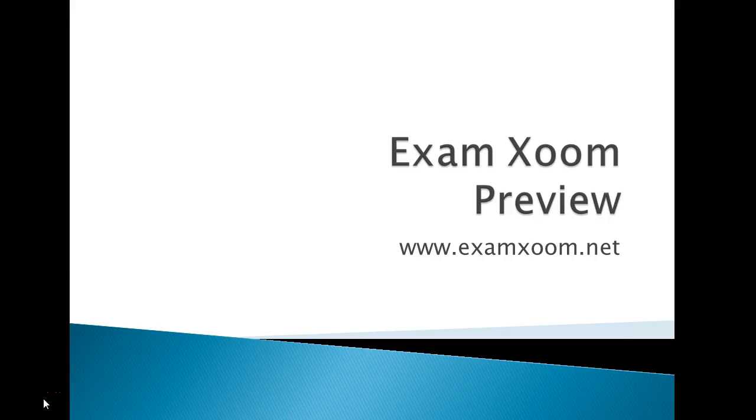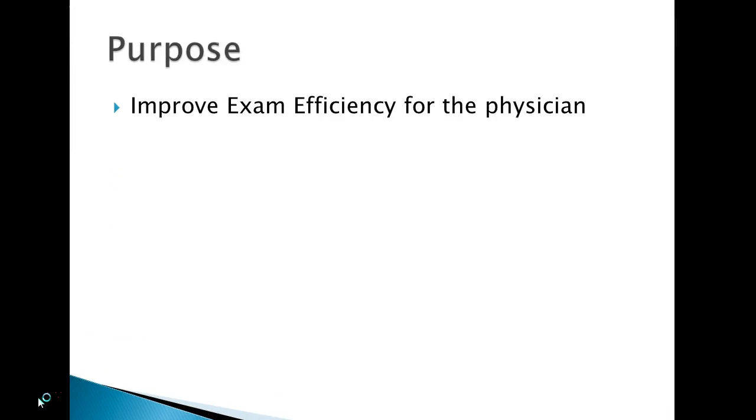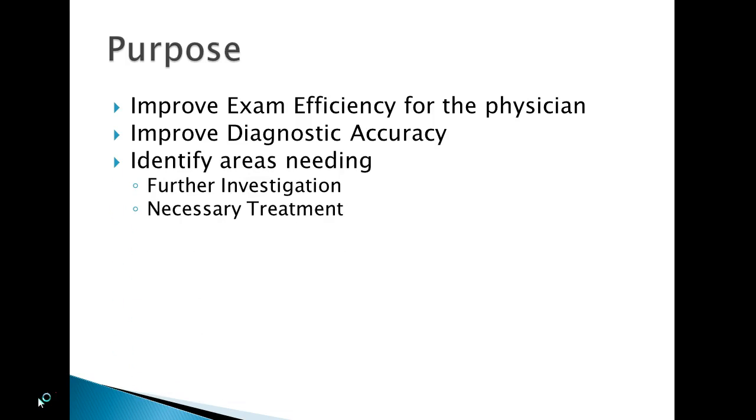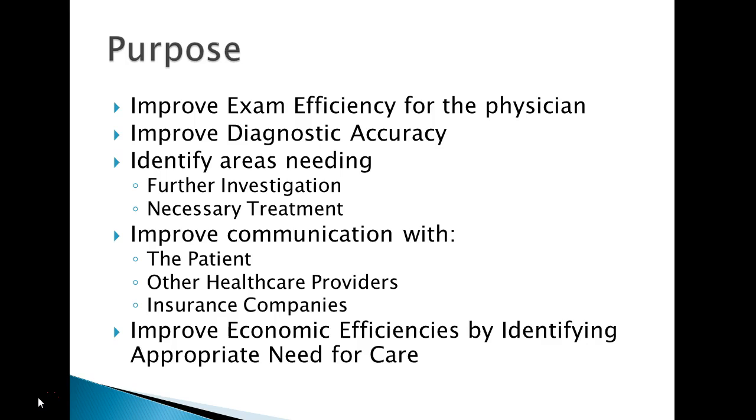This is a preview of the ExamXoom online software system. The purpose of this tool is to improve exam efficiency for the physician, improve diagnostic accuracy, identify areas needing further investigation or necessary treatment, improve communication with the patient, other healthcare providers, and insurance companies, and to improve economic efficiencies by identifying appropriate need for care.